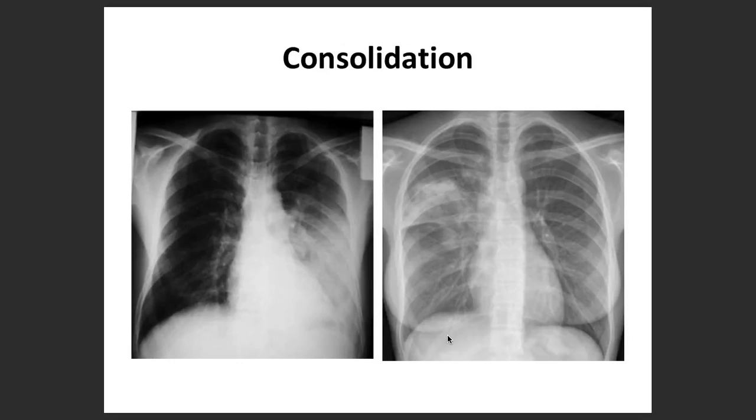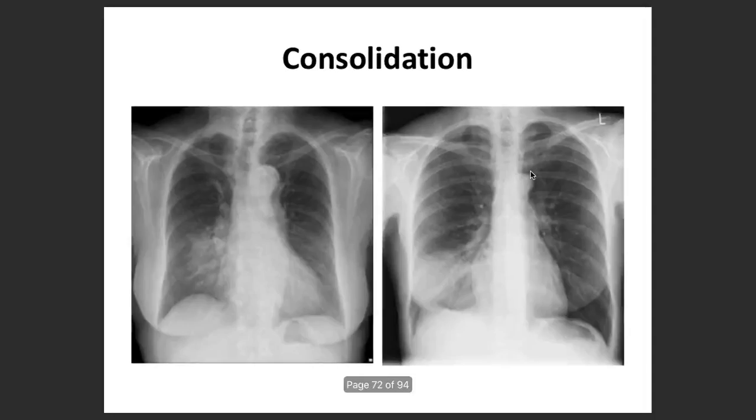So what about the consolidation? About the consolidation, what happens is, you can see over here, right? And then comes the collapse. So what do you notice in collapse? Anyone would like to try? Shifting of trachea. Good, good, good. And lung opacities.